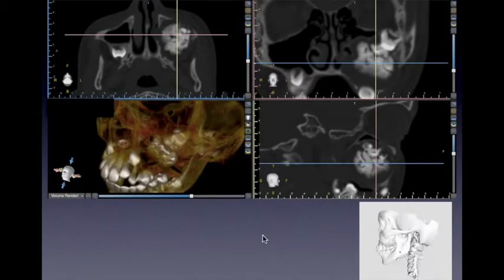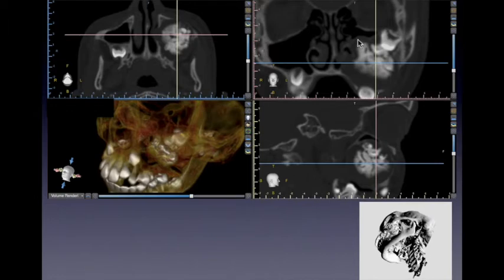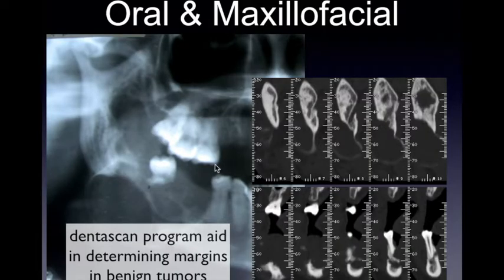Another view of another case of a young child with an expansile mass that shows density that is almost similar to that of tooth structure and therefore is highly suggestive of a calcifications. This goes to clinical application.